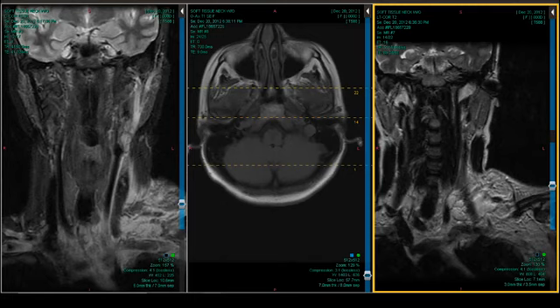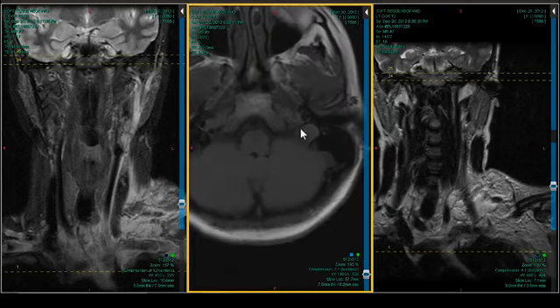The fact that we see this giant thumb right here, I was wrong, all the way up high, the jugular vein is totally wasted. It's socked in by a big, gray, smooth clot. Gray, bad. Smooth, bad. Absence of pulsation phenomenon, bad. Length, bad. Edema, bad. Pregnancy, not bad, but in this case, risky. She's hypercoagulable, and she has to be checked for some of these hypercoagulable states and risks.